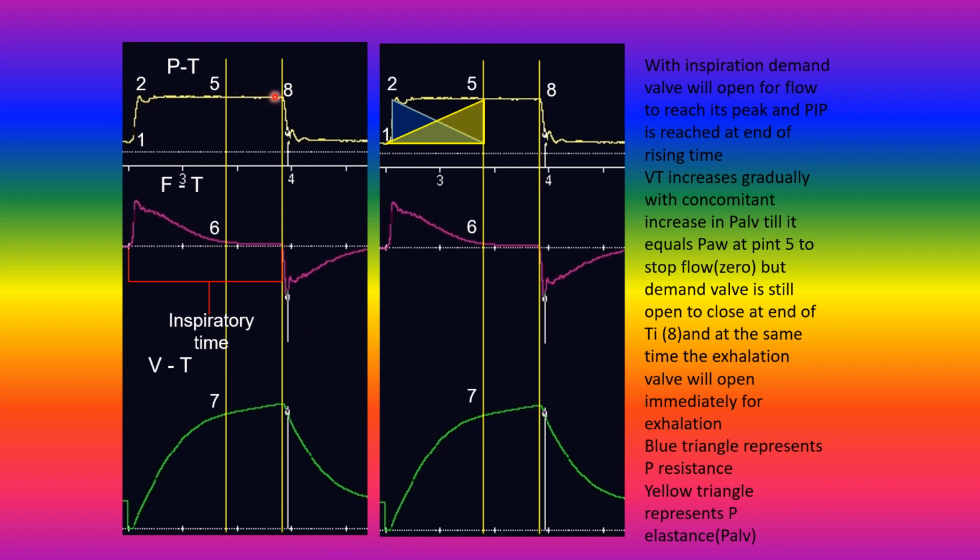This is a pressure-time curve. Look, the inspiratory time is large. And here the flow came to zero before the end of the inspiratory time to develop an inspiratory pause.